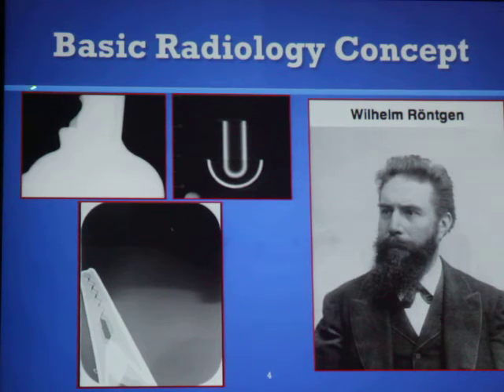So to come from that X-ray to that X-ray, why does it make sense? Because we can see two different colors, or more than two different densities, of the object here. We can see it is much brighter here, then lighter in the middle, then brighter again. There is a black color, and you can see the shape as well. What it creates is a contrast between two different objects, and that helps us to identify the object on the radiograph.